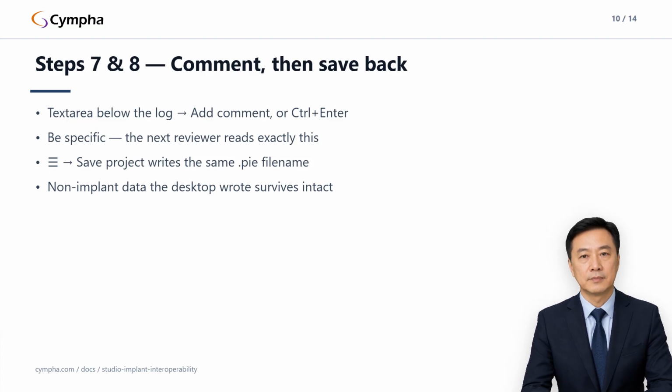While a project is active, Save Project writes back to that project. To produce a plan snapshot from the same scene, you use Export Plan explicitly. Project file for the collaboration, plan file for the handoff. That's the division of labor.